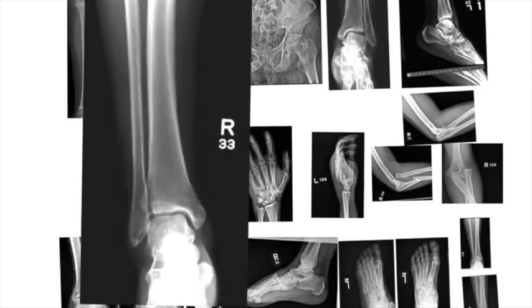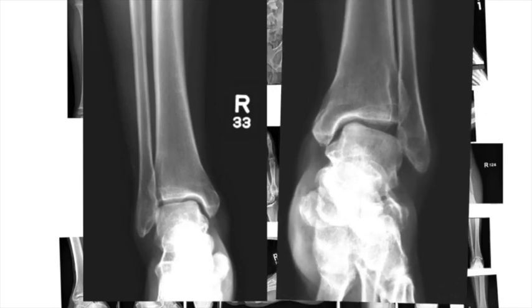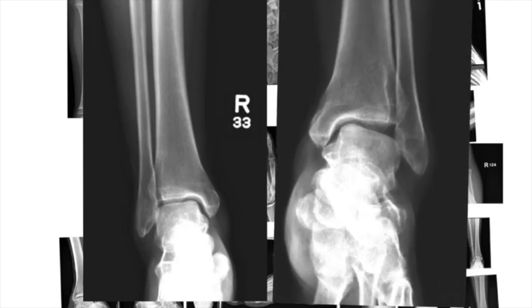To illustrate, I'm going to bring up two x-rays of the ankle. One of them is normal and the other one is not. The things that you're going to look for is first alignment. So are the bones aligned with each other in an anatomical orientation? Then the next you're going to look at is the joint space, and you're going to follow whatever joint space there is and make sure that the joint space looks smooth and symmetric.